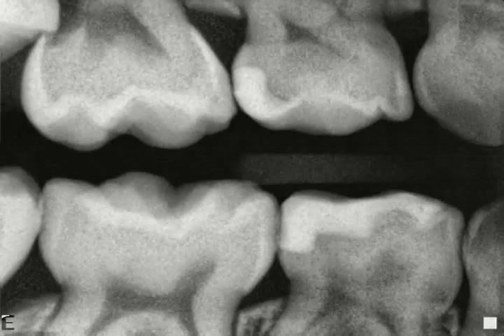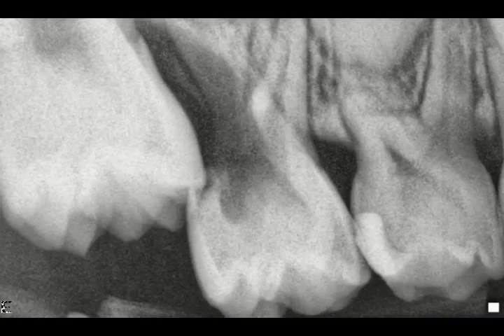Impaction occurs when one tooth is against another tooth. In this case, the first permanent molar is up against the second primary molar and is dissolving it away. This x-ray was taken 6 months after the previous x-ray. It is very clear now what damage is being done to the tooth in front of the one erupting into the mouth. In fact, it is clear that the primary molar is being completely dissolved away, with one of the two roots already completely gone.